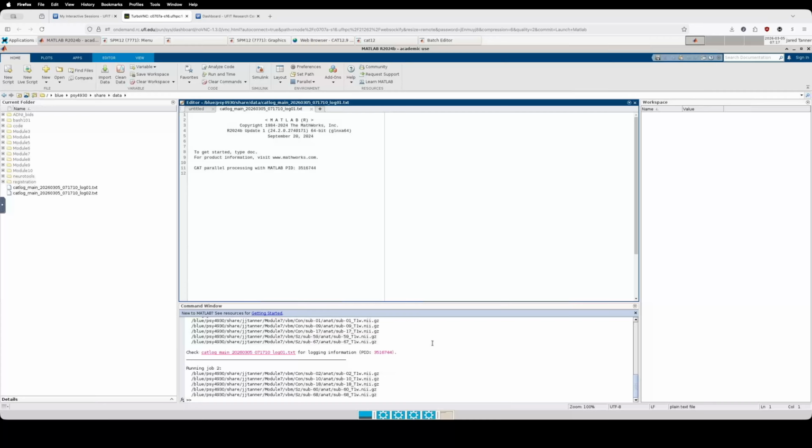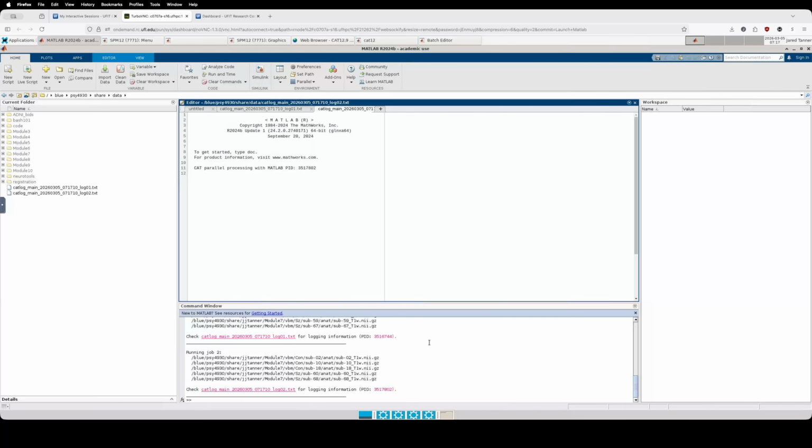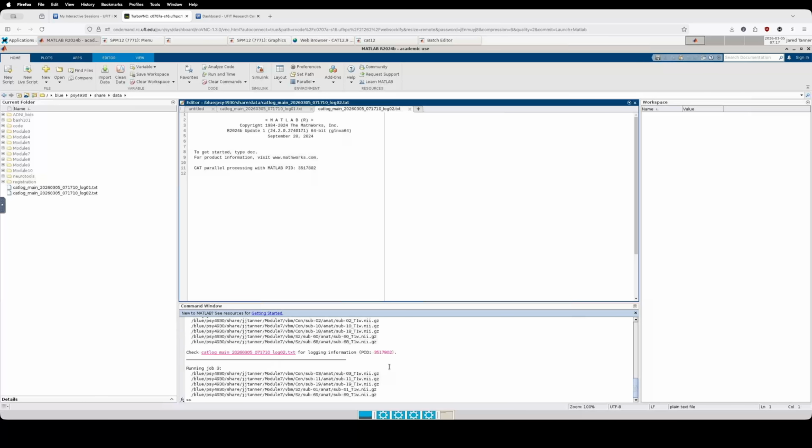You could check it in an hour from now and see if it's done. It will tell you if it's done. You won't get an email or anything, but you have to look at the window and it'll tell you. If it's not done, then come back half an hour or an hour later, and once it's all done, then you can finish everything up.